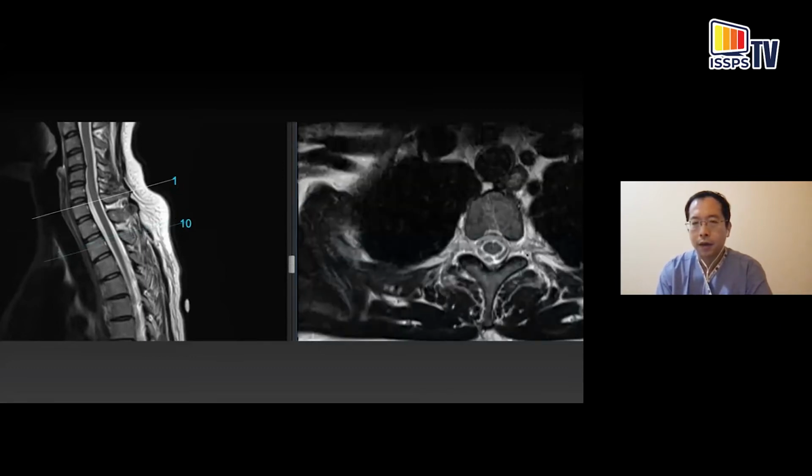So now here is the so-called classic thoracic paravertebral space, where below the transverse process, you see the nerve roots and their accompanying neurovascular bundles. And you can see how rich the conglomeration of vessels are around the nerve roots in this area. So you really have to be very careful and gentle as you enter, and if you're performing a procedure, try and hydrodissect a little bit to push away these vessels.